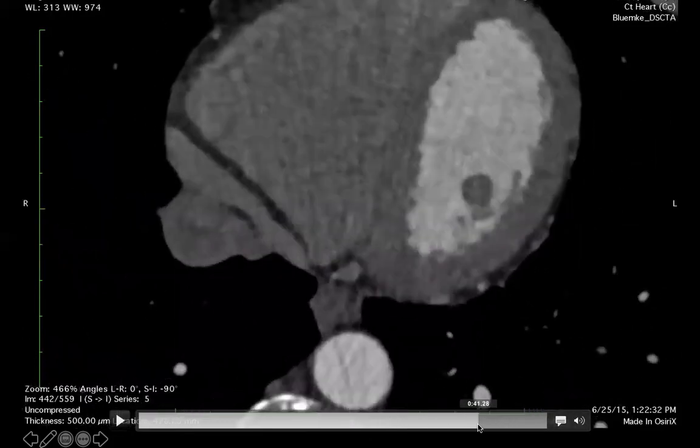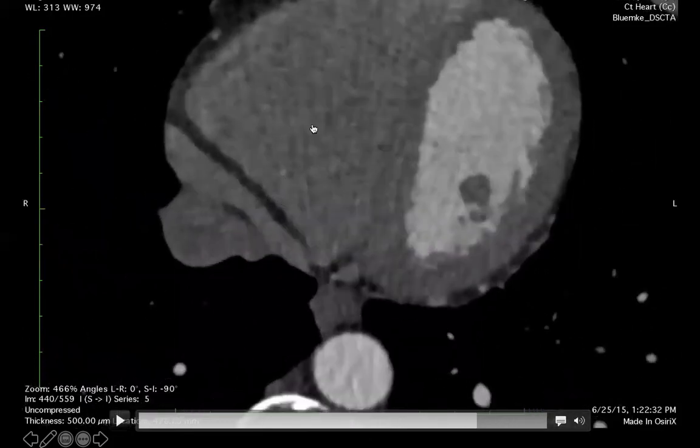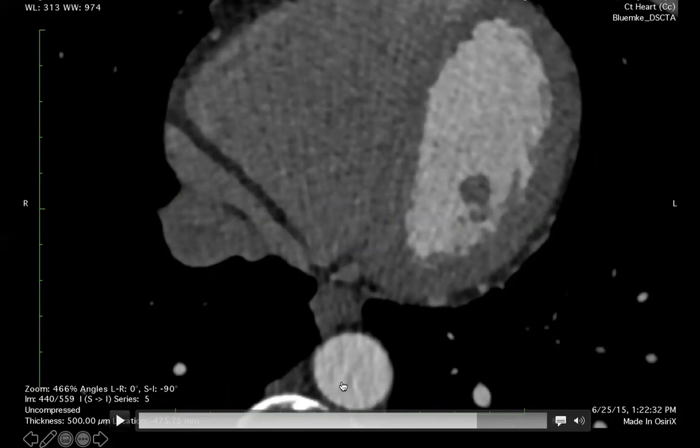And you can see that there's an interesting noise pattern which radiates away, and it seems to be radiating from a source, and that source is down here. And it is the very bright signal from the aorta, which has blood with contrast in it right now. So it's attenuating a lot of X-rays and casting a fairly strong shadow, as is the spine, which is over here in the image.